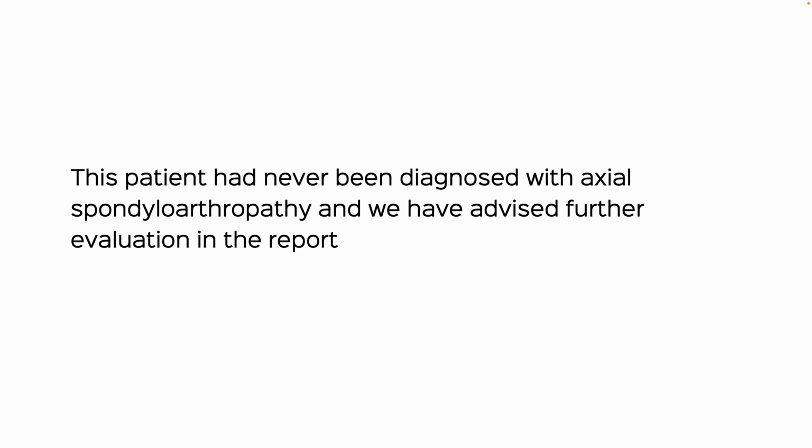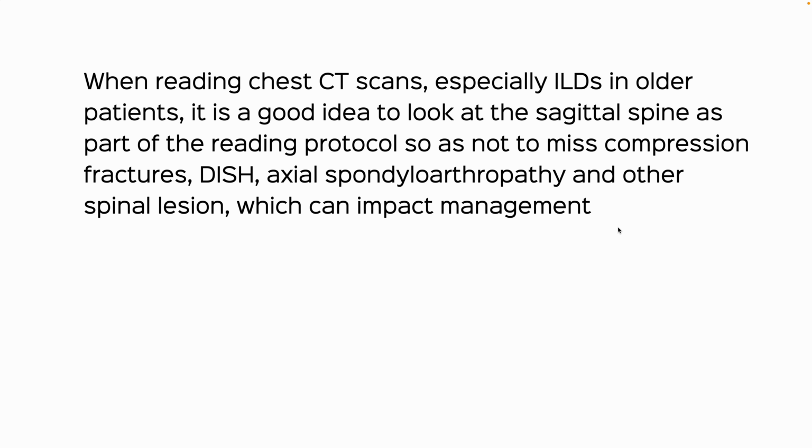This patient had never been diagnosed with axial spondyloarthropathy. So we called them up and found out, and they said no. And so we've now advised further evaluation because maybe the patient is symptomatic. We weren't able to gauge that, and maybe that would impact the quality of life.